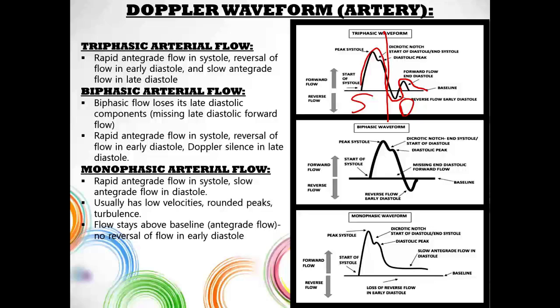Biphasic pattern, you're going to lose some of this diastolic component. So it's missing your late diastolic forward flow. So you're going to have your rapid antegrade flow in systole. You're going to have that reversal flow, but then you're going to have Doppler silence. It's not going to come back up above the baseline.